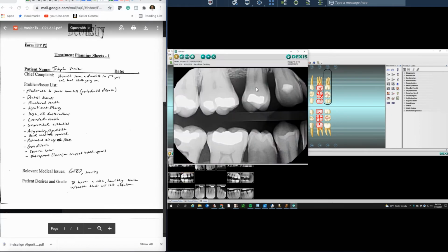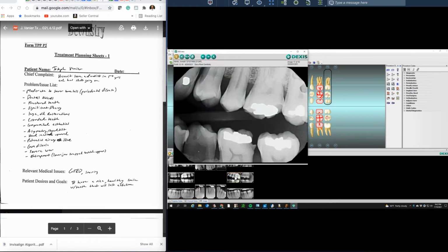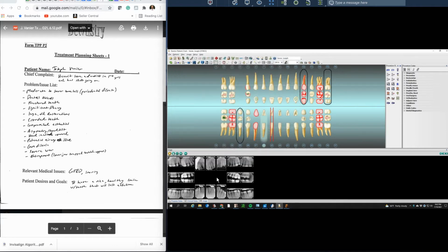Let's look at the bite wings. Yeah, definitely some tartar buildup, but I wouldn't say this is a full-blown perio case, but more something that requires some basic SRPs. But I'm sure you and the hygienist have either already done this or discussed this with the patient. But we should see some success coming out of this case. So definitely not a case we need to refer to the periodontist. When we need to, we should, and this is not one of those times.